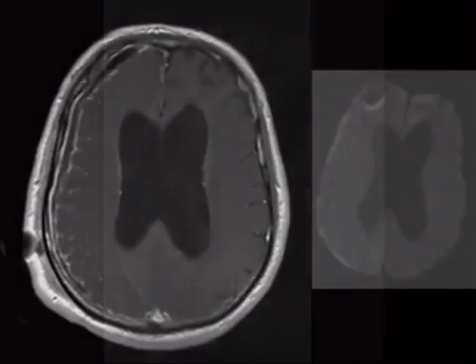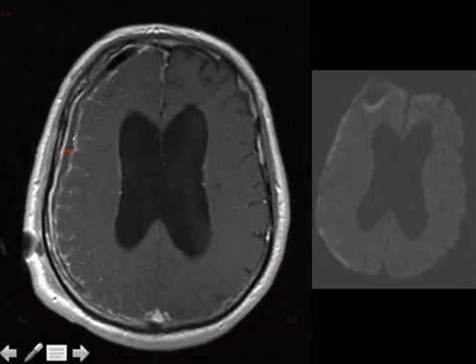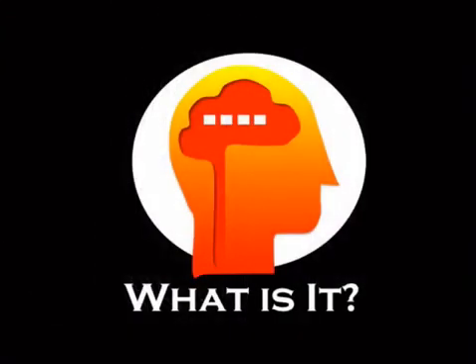Okay, next case, another diffusion case, and you're seeing this subdural looking thing that's restricted diffusion, and that is a classic way to tell you that there's a subdural empyema, a fluid collection there that's infected. So, it's this stuff here. We can see dural and leptomeningeal enhancement, and corresponding restricted diffusion, so that's pus. Boom. All right.